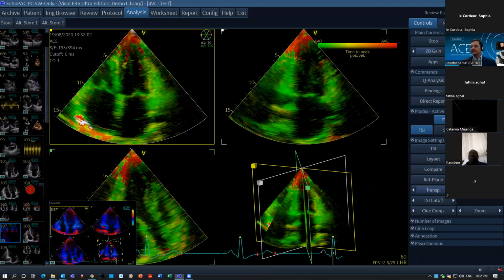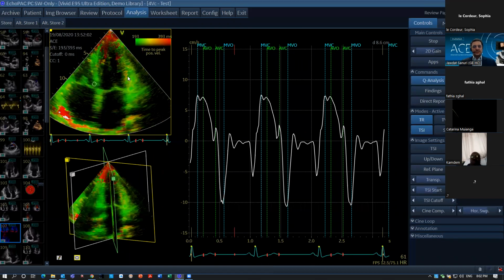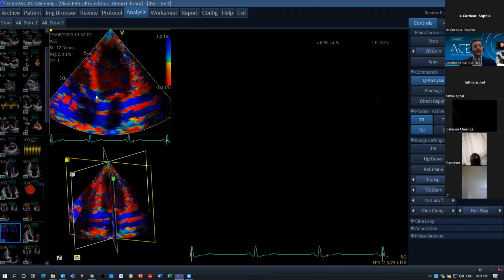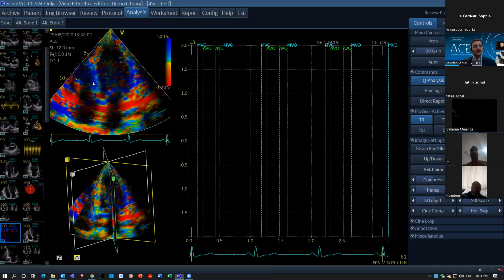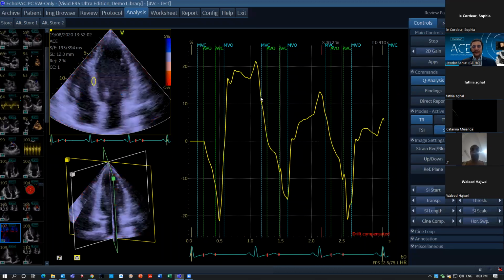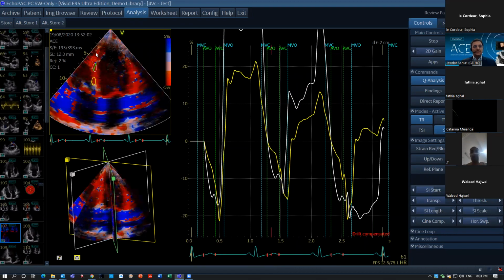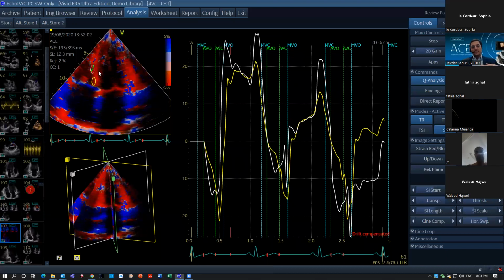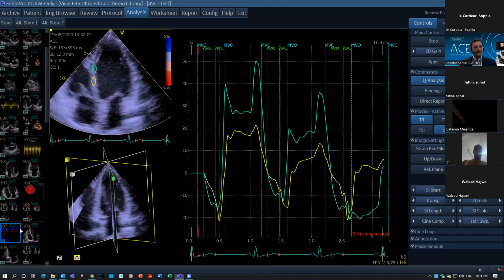However, we can also do Q analysis. We can look at the parametric imaging, the velocities at each position, and we can also do the strain rate imaging, for example, and the strain imaging, and we can do the actual strain rate values for each area and the strain value for each segment. So here, for example, this segment, here's the strain curve, and you can see the peak systolic strain is 20. And you can see the green line showing the angle of the beam, because whatever the origin of the signal is, that's where the angle is. And you can see the more lateral you are, the more off axis you are angle-wise, even here. So this is again the pitfall of tissue velocity strain.